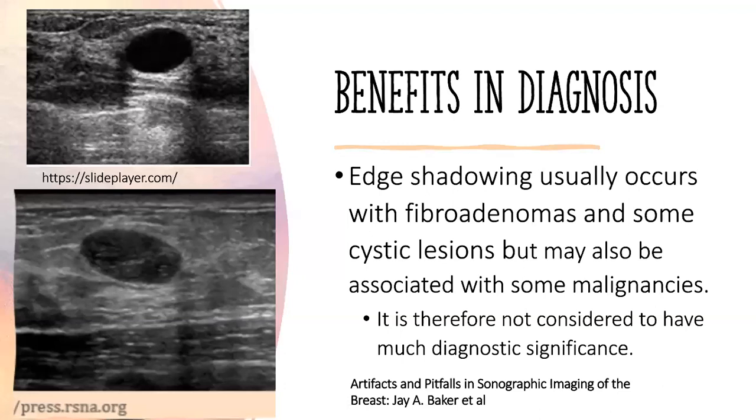What are some of the benefits in diagnosis? Well, we know edge shadowing to occur mostly in fibroadenomas, as well as in some cystic lesions, but it may also be associated with some malignancies. Therefore, according to the article stated below, they don't consider this artifact to have much diagnostic significance.